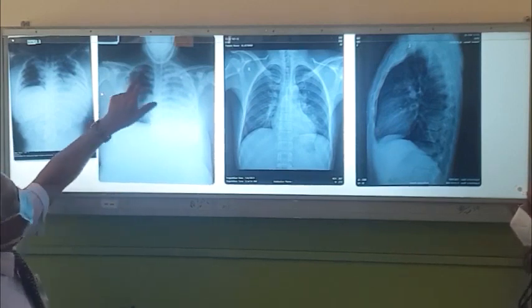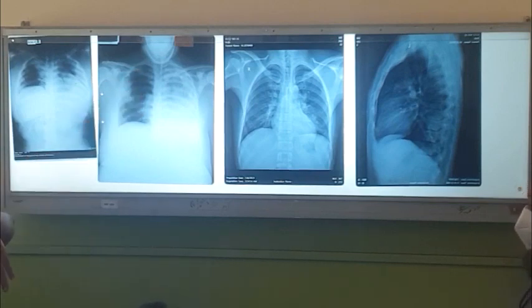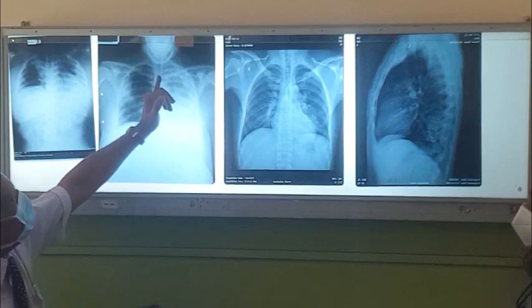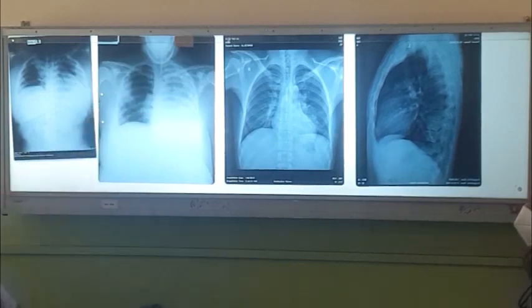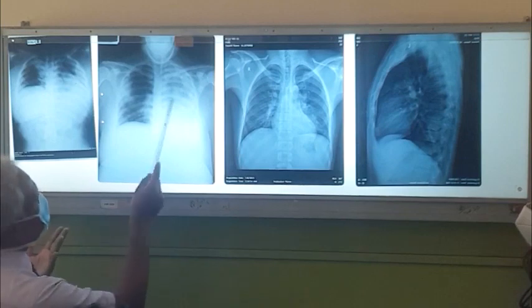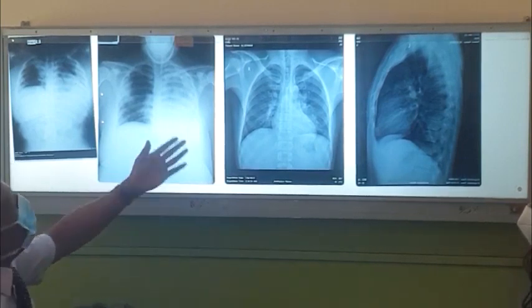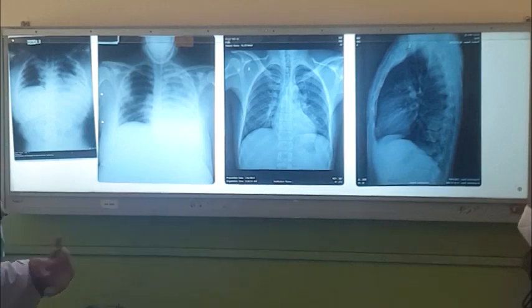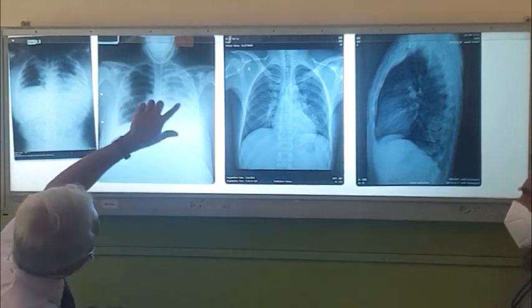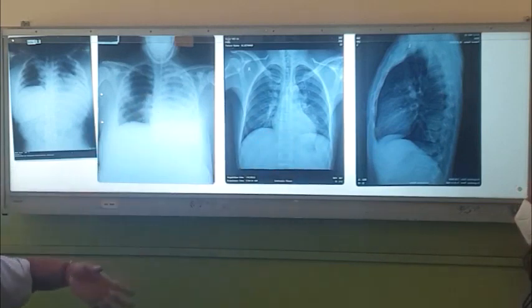So that is why this area is the normal lung tissue, which is dark. Okay. So this is an overexposed, well-centered AP field. And what you see here, now I can't see the cardiac shadow here, it has shifted there. I can't see the descending aorta, I can't see the left hemidiaphragm, I can't demonstrate the normal anatomy there. So look for the normal anatomy. Like in this case, I can't see the left heart border, right?